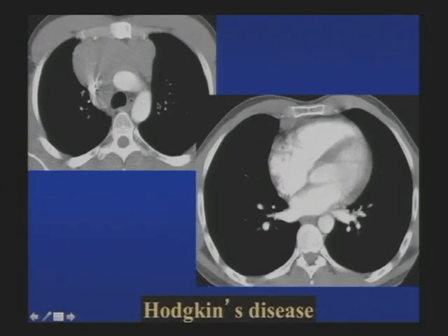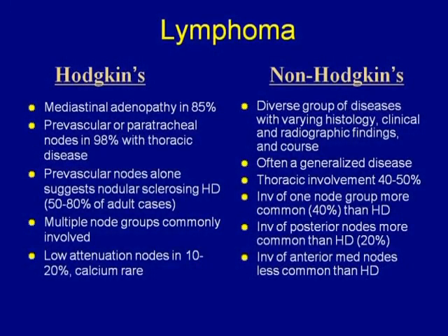What suggests lymphoma to me? Exactly this, a tumor that's very infiltrative. It doesn't produce a lot of mass effect in proportion to its size. So it's enormous, but the aorta is not narrowed, or the SVC is narrow, but not that much. Okay, it doesn't produce a lot of mass effect.